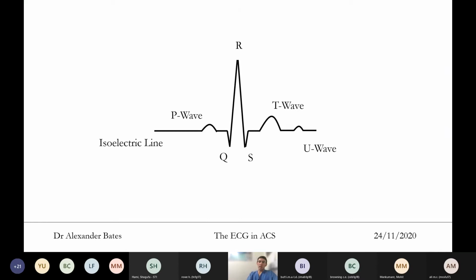So this is our typical ECG pattern that we'll see probably in V4, V5, V6. This is what T wave inversion looks like. R wave is going up, T wave is going down. And that might be something you might see at the start of an NSTEMI, but you may see something that looks like this. That is big, deep T wave inversion. That is very, very concerning.